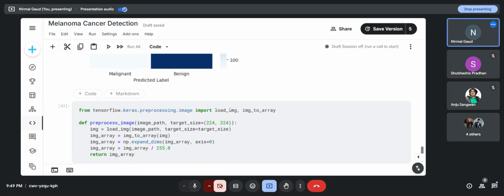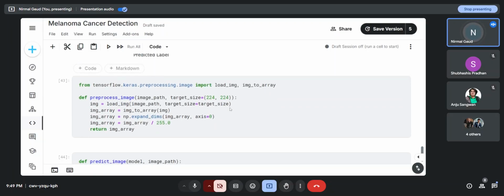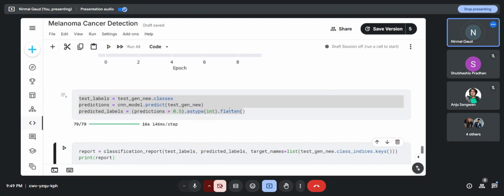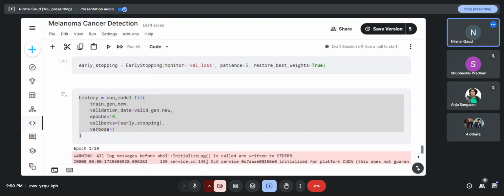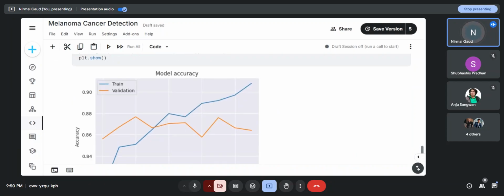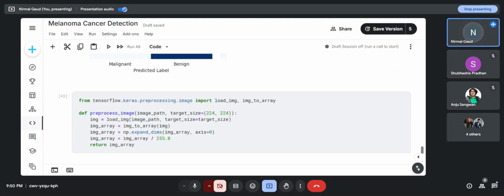Then it has been asked to me, sir, can you perform the prediction? You got a trained model. So I am having this Inception model, trained model. This CNN model, Inception one, is trained now. It's ready to perform the prediction. I can do that.